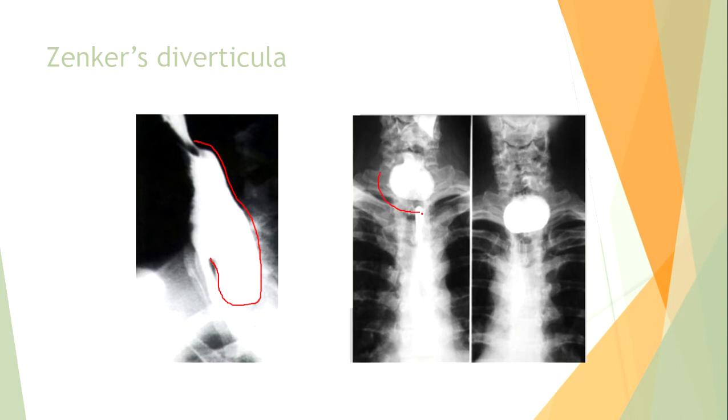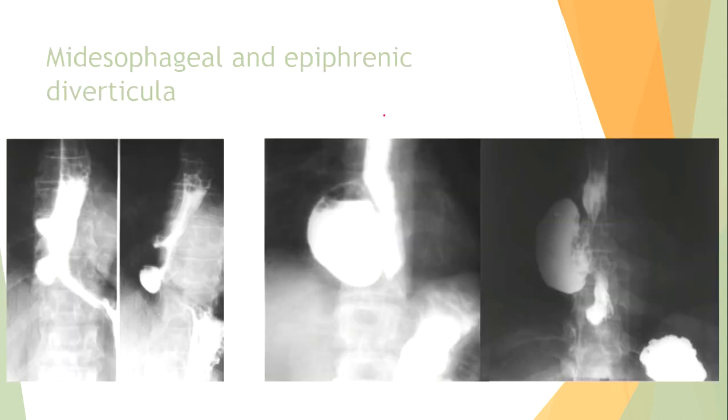And this is the frontal view. If we have diverticula in the middle or lower part of the esophagus, we have this picture.